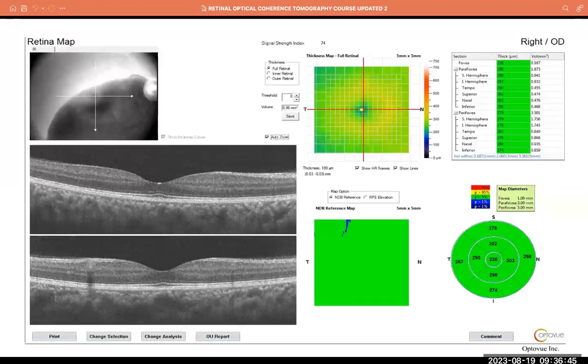So what this means is if you are looking out for something and you get a scan like this, and what you're looking out for is not there, you have to go back and have them repeat the test or move the line yourself on the machine. It can be done. You can move the line till it intersects in the right place, okay? Now, the parameters have been represented on the square box to the most right.